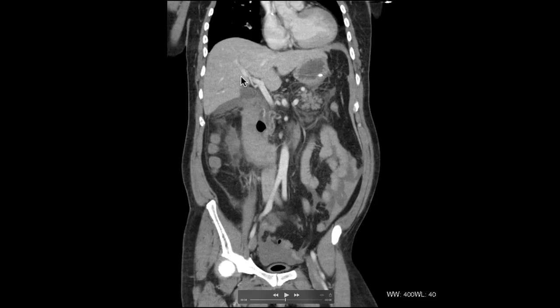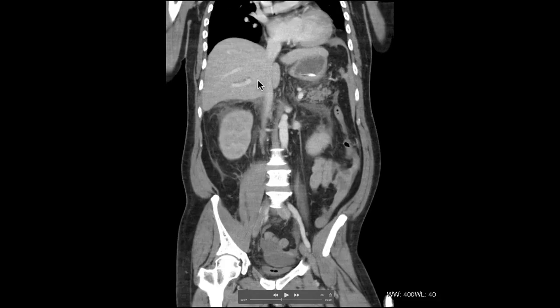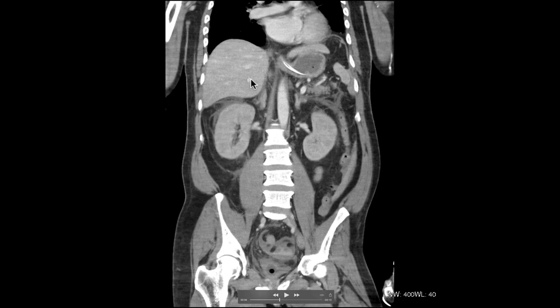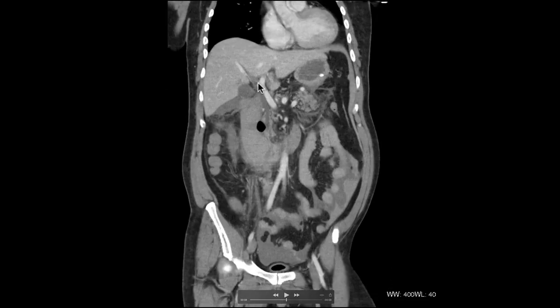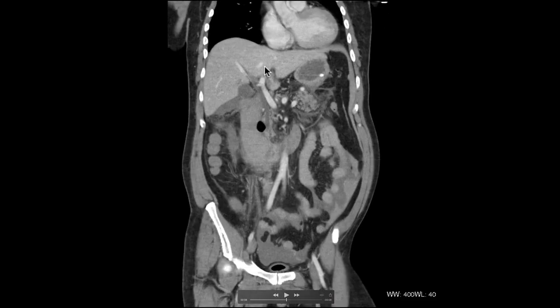Liver looks okay. You'd be worried about some biliary dilatation. You can see that's the CBD there, maybe a tiny bit plump, but not significantly dilated. And importantly, there's not really much in the way of intrahepatic duct dilatation. You can just about make out the right-sided ducts there running next to the portal vein branches, and the same on the left there. You can see some small intrahepatic ducts, but they're normal.